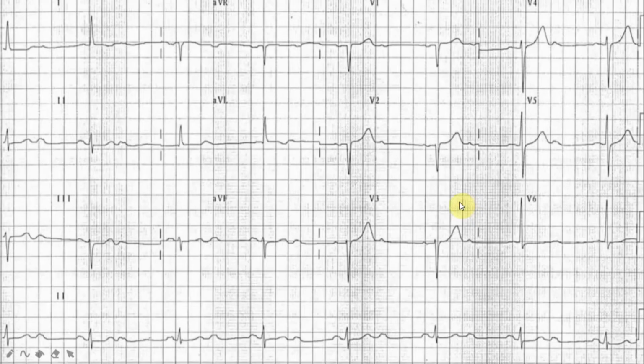All right. Now this is going to be really hard, but I'm pretty sure that Becky can help us in interpreting this ECG. Thank you. Well, this is a complicated ECG, Avijit. Still, I think I'll give it a try. As always, let me interpret this ECG in a very systematic way so that I don't miss any important piece of information.